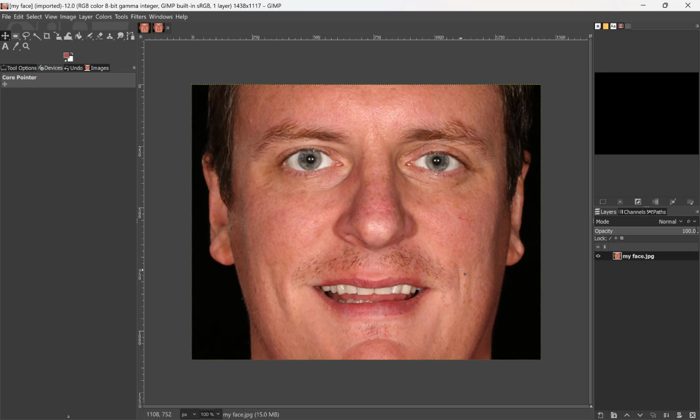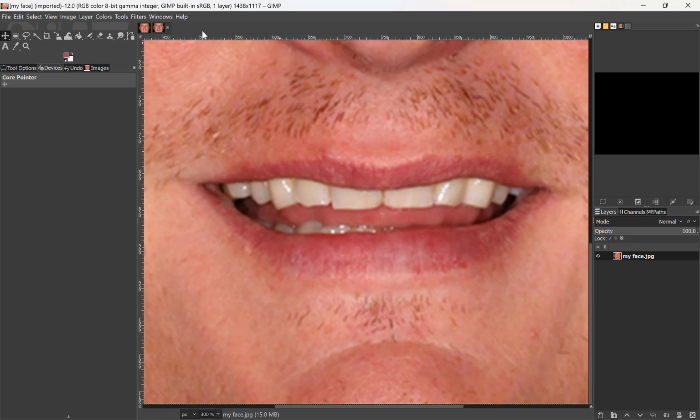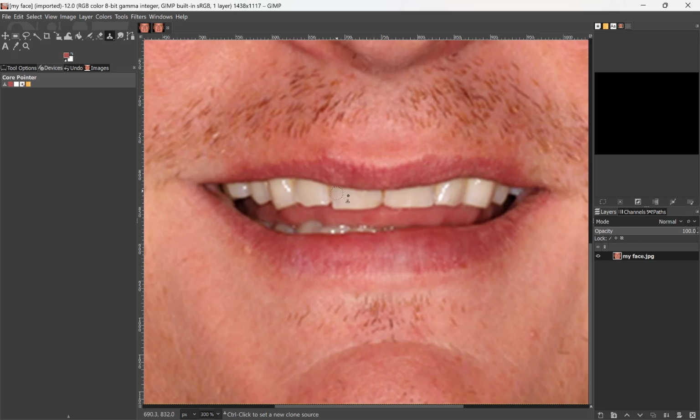The better, higher detail picture you can get from straight on smiling, the better you're going to be able to do simulations. Okay, so let's talk about just a couple of easy options that we could do here. If you just needed to make a couple of corrections on teeth and really not change a lot, let's suppose that I had been proposed to do some incisal lengthening in composite. Well, there's a lot of ways I could accomplish that without getting too fancy.